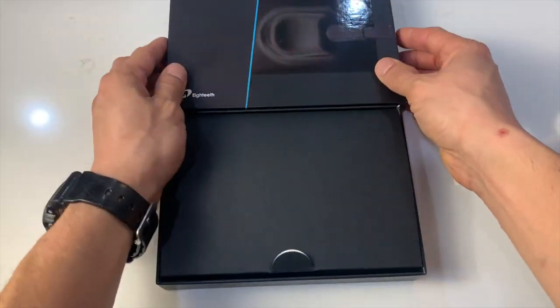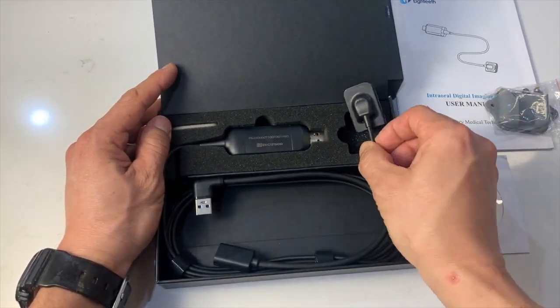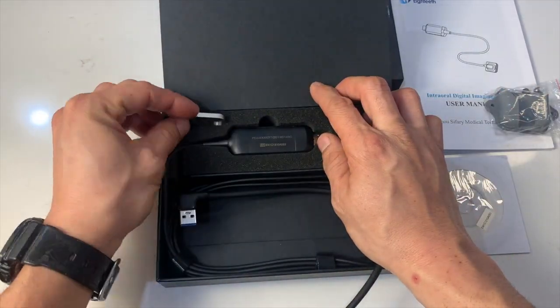This software is packed full of incredible functionality, and you will not be disappointed. Walk with me as I show you some simple tips on how to use the software efficiently in your practice.